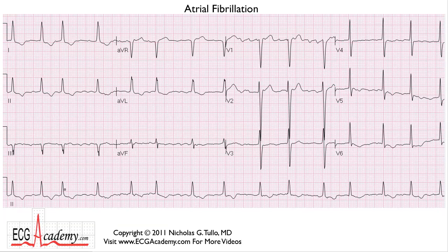The QRS complexes are clearly not marching through at a regular rate. And if you try to look for a pattern in it, you won't find one. And that's the hallmark of atrial fibrillation, it's irregularly irregular. There's no real pattern to it. If there was, you would call it group beating and start looking for some kind of second-degree AV block. But atrial fibrillation should be irregularly irregular.